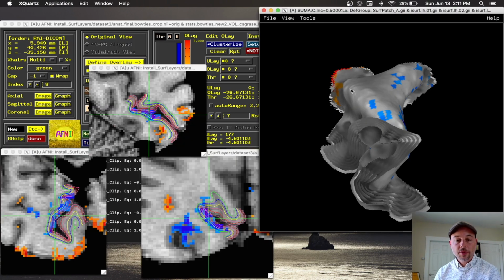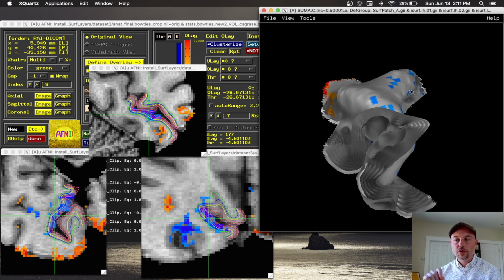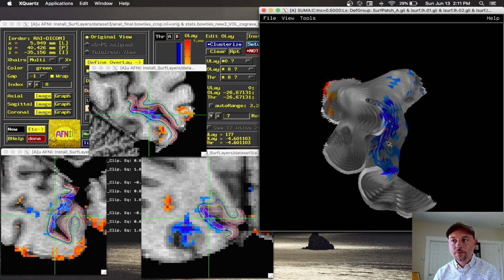Finally, a retinotopic dataset at 7T with the contrast vertical minus horizontal wedges. This shows a patch of the calcarine sulcus that was drawn onto activations projected on a spherical surface. With patches, we can use clipping planes to trim the boundaries, like that.